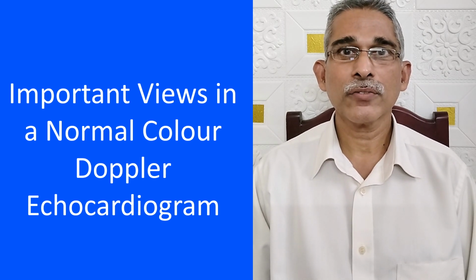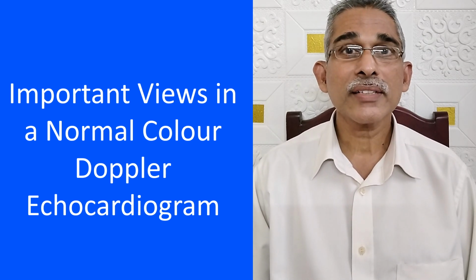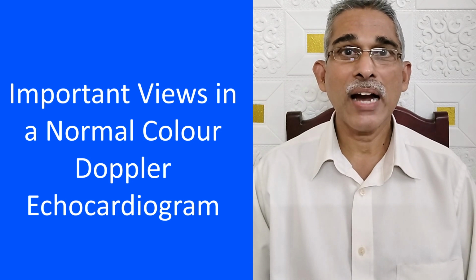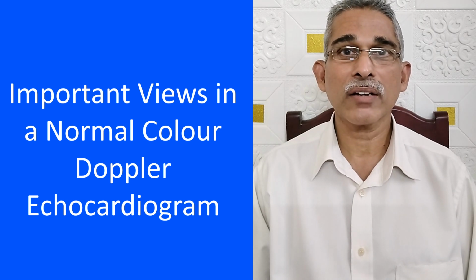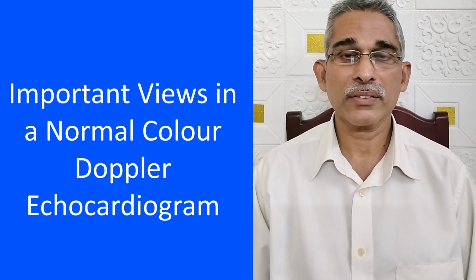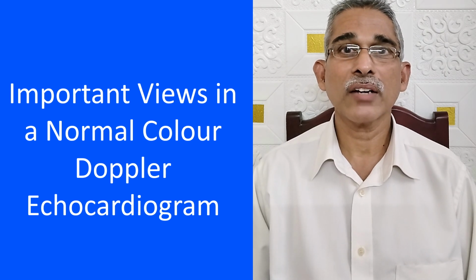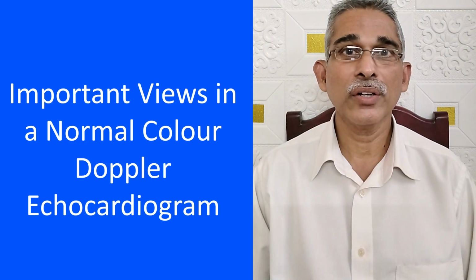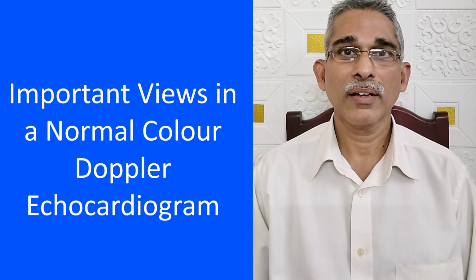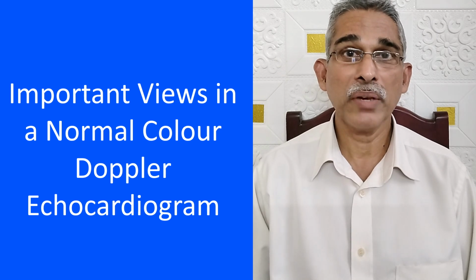Echocardiography is done from the chest wall in certain regions where the lung does not overlap the heart very much. You know that air in the lungs will reflect sound or ultrasound, so the views of the heart will not be good if lung is overlapping the heart. That is why we get a poor echo window in emphysema. So the common views used in echocardiography are those where the lung overlap is minimum.